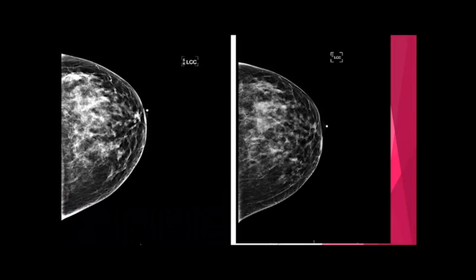So here's the callback. The same technologist got her, and that doesn't always happen unless you have one technologist at your facility. Like we have 24. So with the same technologist getting her, it's pretty rare. So the same technologist did get the tech repeat, and you could see the nipple is more centered. They got more retroglandular fat and more end of the parenchymal pattern.